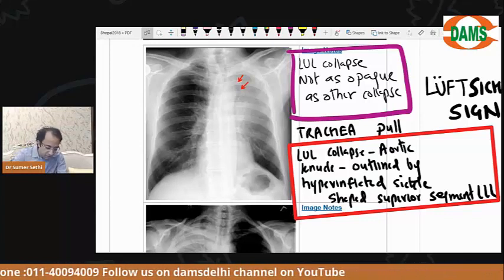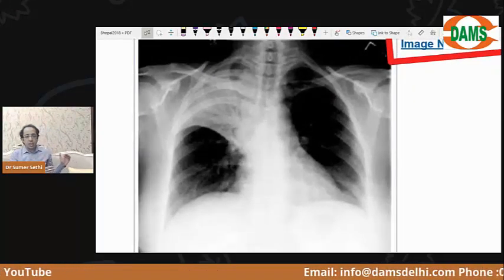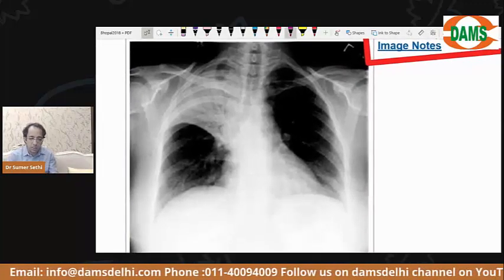Now let's see if you are able to answer this. After we look at the next X-ray, we should be able to make a concept. Let's see if you can answer better.